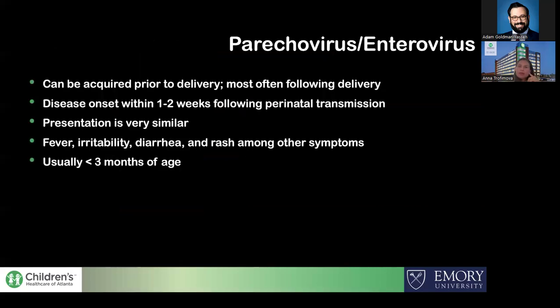Another acquired infection that I just wanted to briefly mention is related to parechovirus or enterovirus infection. In terms of their clinical and imaging manifestation, they have a very similar presentation, so that's why we're going to be discussing them at the same time.